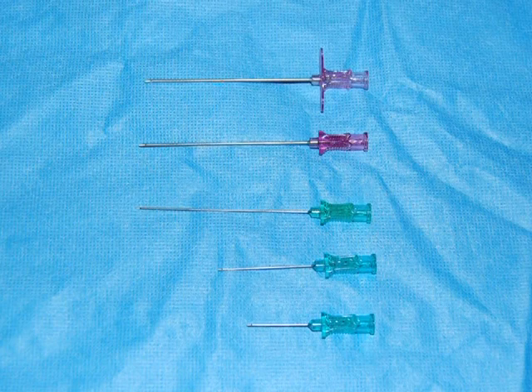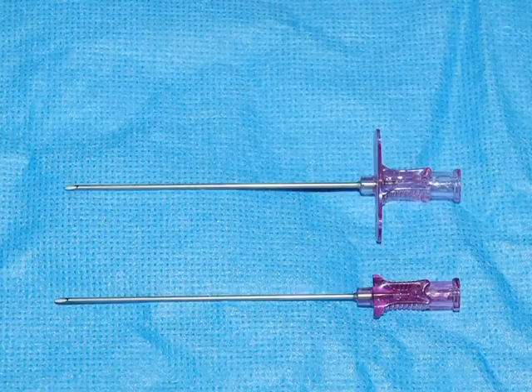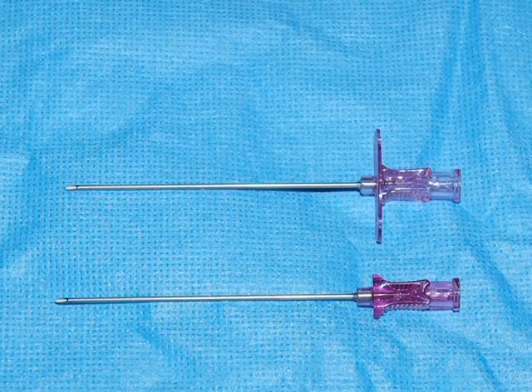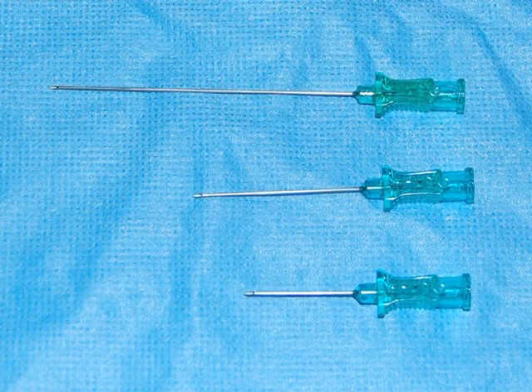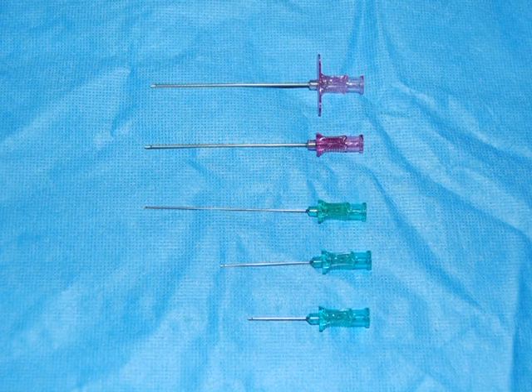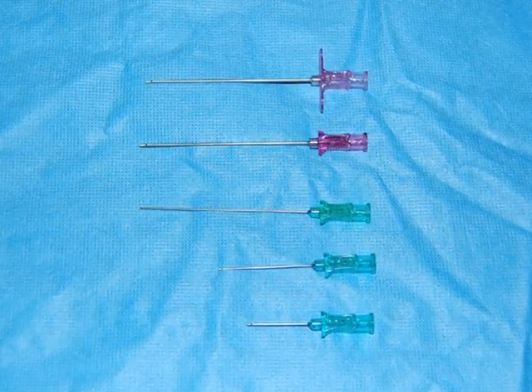There are many different kinds of needles available, the most common of which are long femoral needles of 16 to 18 gauge diameters and shorter micropuncture needles used for both femoral and radial access. In general, the brachial artery should not be an access site of first, second, or third choice.